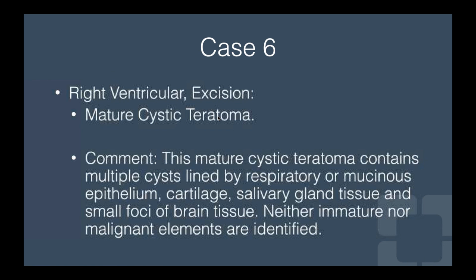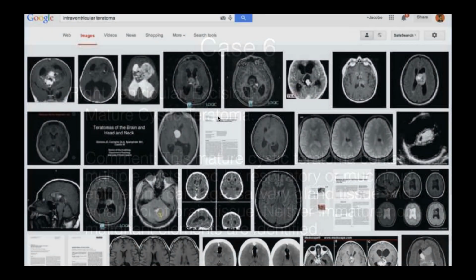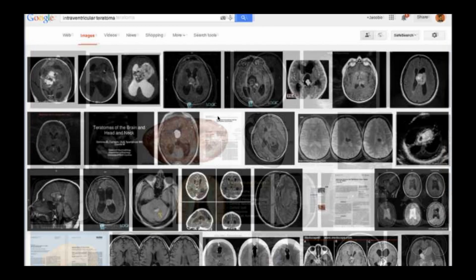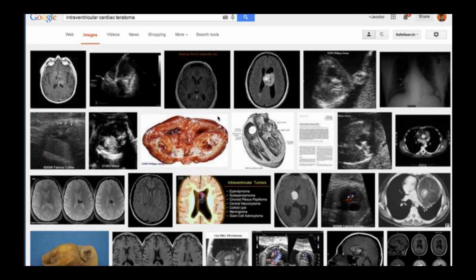Any thoughts of what that can be, those very complex? What if you had one of these somewhere else in your body, like let's say an ovary? Teratoma, teratoma is a great thought. Or like a dermoid or teratoma. Yeah. Is this a man? This was a male. Yeah. Man, yeah.